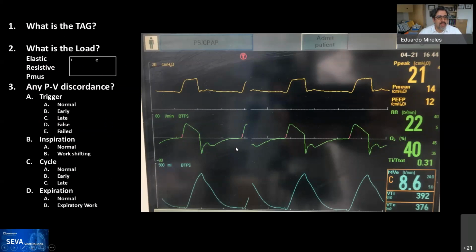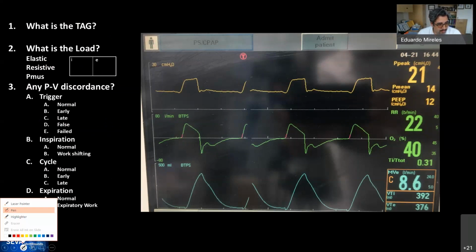Okay. So we start with a basic waveform on one of our patients. Does anybody want to read this, from our fellows or RTs from the clinic on the line? Have no fear. The goal is to do as best as we can. Anybody? I can do it. All right. Let me just mute the other one. Okay, thank you, Marina.